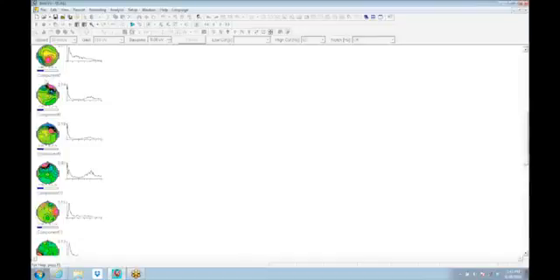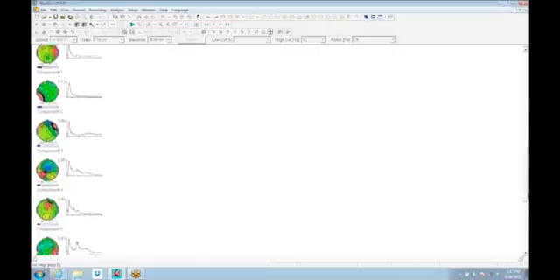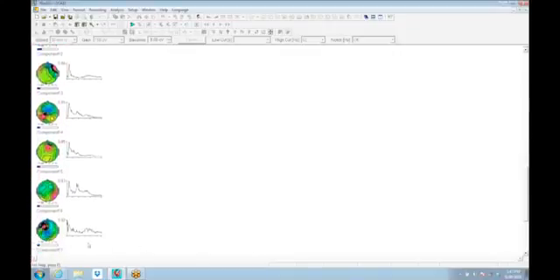The good possibility that that may have been muscle artifact from what it looks like. There's fast activity off to the left. There's slower, but it's still fast activity, probably muscle. So you basically drop down through the various components and what is being generated.